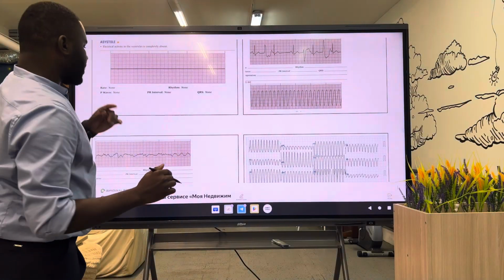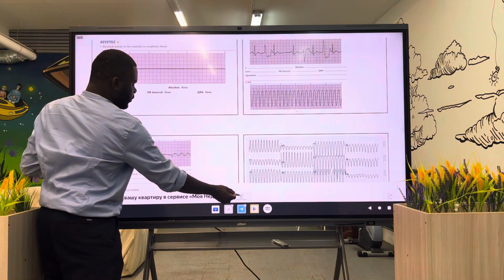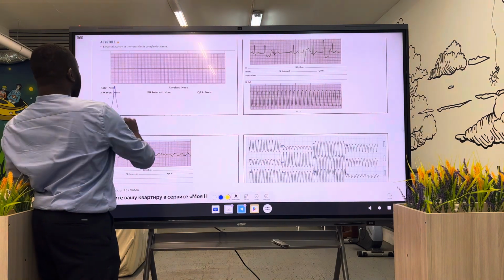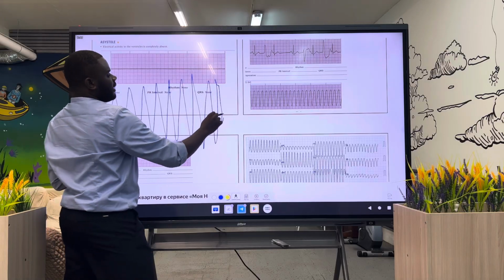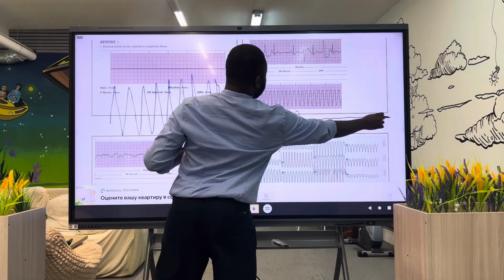Now, in clinical cases, usually what happens is that after a case of extrasystoles, the heart is going to try to compensate, it's going to start contracting so fast. The ventricle misbehaving. Then when it gets tired, this happens. Then after this happens, it gets more tired.